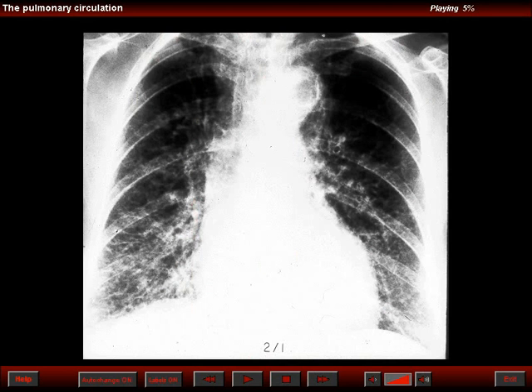In this patient with interstitial pulmonary edema, secondary to left ventricular failure, we see all the A, B, and C lines. The A lines radiate from the hila like a sunburst. The B lines are horizontal lines in the lower portions of the lung, and they run usually perpendicular to the chest wall. And the C lines represent a reticulum due to the crisscrossing of the septa surrounding the secondary lobules of the lung.